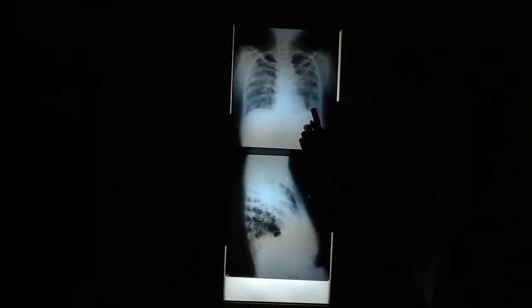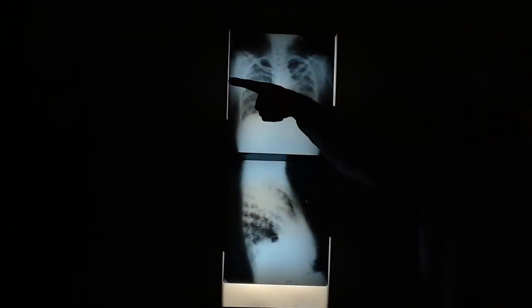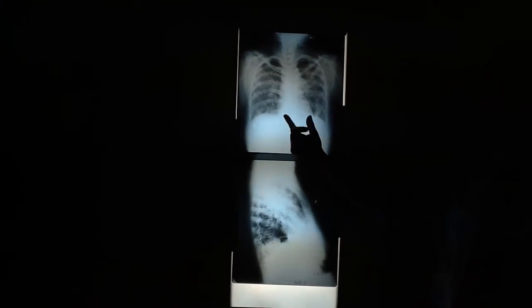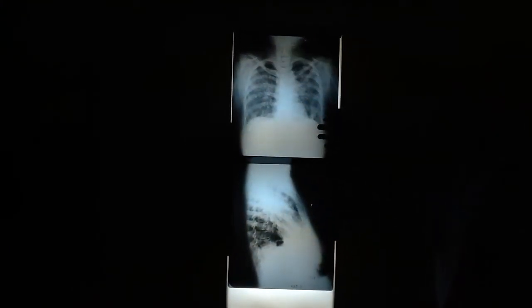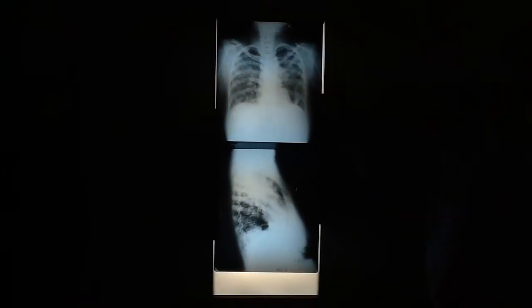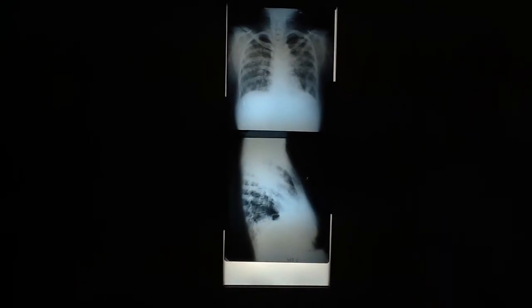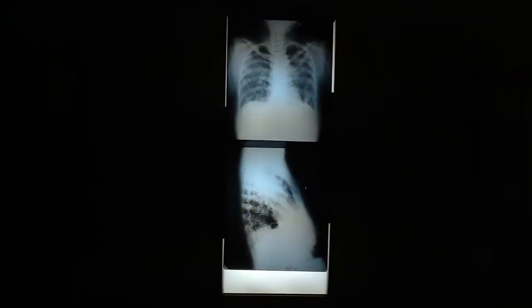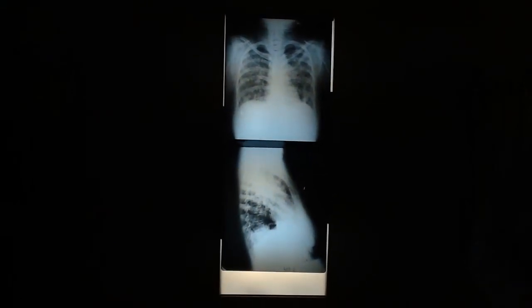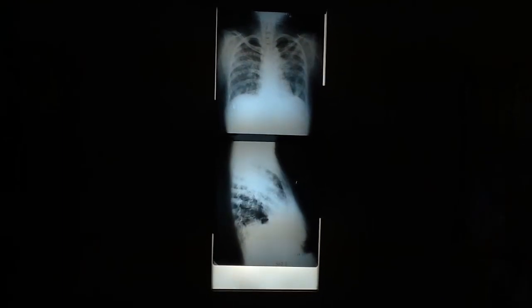And then look at these lungs. What's different about these lungs versus those? Bilateral, diffuse, non-homogeneous. Yes. Bilateral, widely spread, non-homogeneous increase in density. And those findings are typical of interstitial disease. That's the middle of our flow chart.